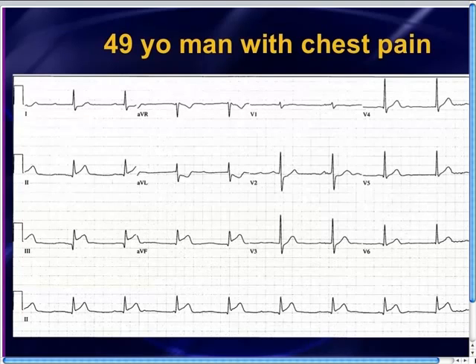If you want to know whether the inferior infarction is extending to the posterior part of the heart, the simplest thing to do is to do a couple of posterior leads. However, in this particular case, you can probably diagnose posterior extension of the inferior infarction even without the use of posterior leads, because this patient has a very classic finding for posterior extension.